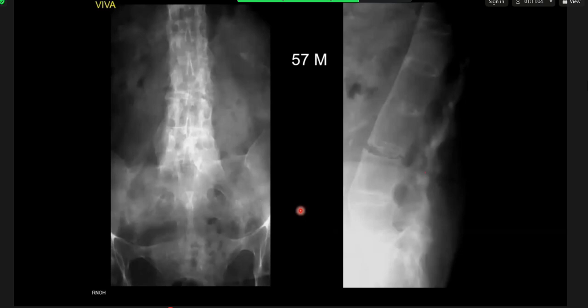In the lateral radiograph in particular, it is evident that there's a transverse lucency passing through one of the syndesmophytes, which appears to be in the lumbar region. Especially in the context of trauma, which might be minor, I would consider that there may be a fracture and have a low threshold for CT.